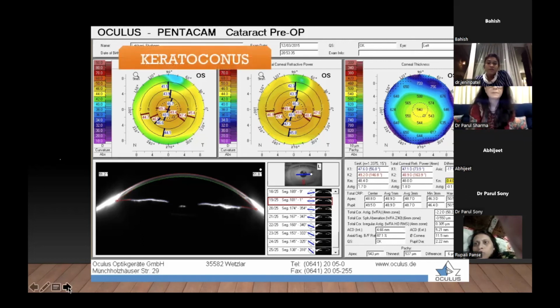Dr. Jenin, just a question. Does the total corneal refractive power mean what we have as TK on these optical biometers? No. Let's say you have EKR values. That is your EKR Ks that are there. The net power of the cornea will always be 1 diopter less than your EKR values. That is a set thing on the Pentacam. These are the powers that you want to look into when you're trying to assess the case or use it for a formula.